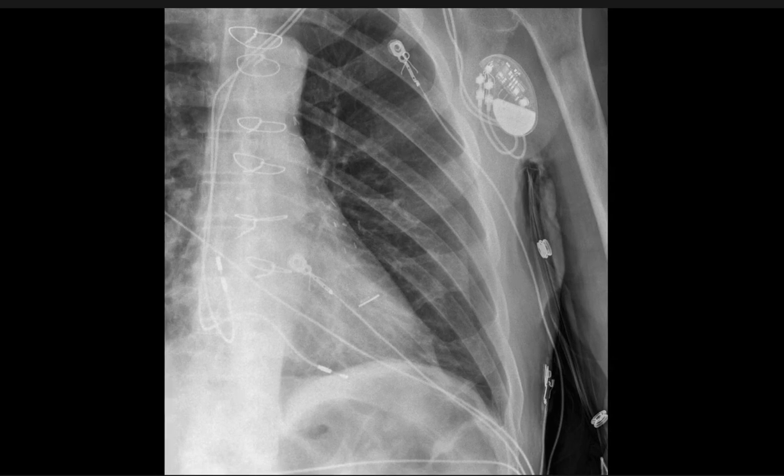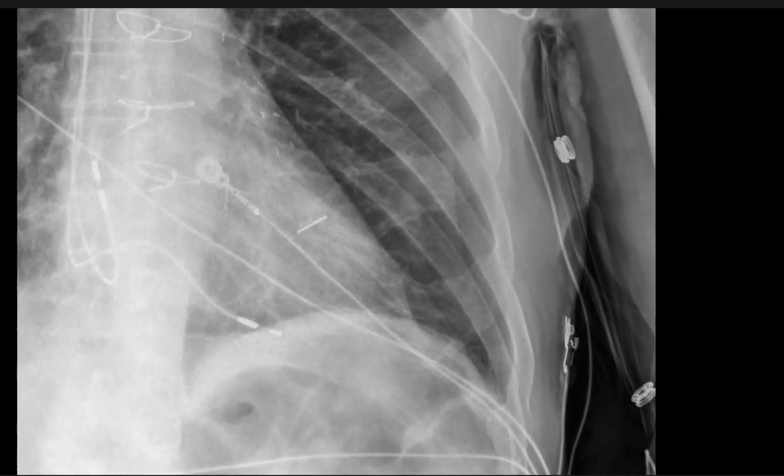All right, so now I want to talk about the primary pretender, the main pretender, the chief mimic for the pneumothorax. So, got a case here, zoom in. All right, we're talking about this guy right here. How do I know that that is not a pneumothorax? This guy. Looks like a line, right? Looks like a line. Okay, so let's review real quick.